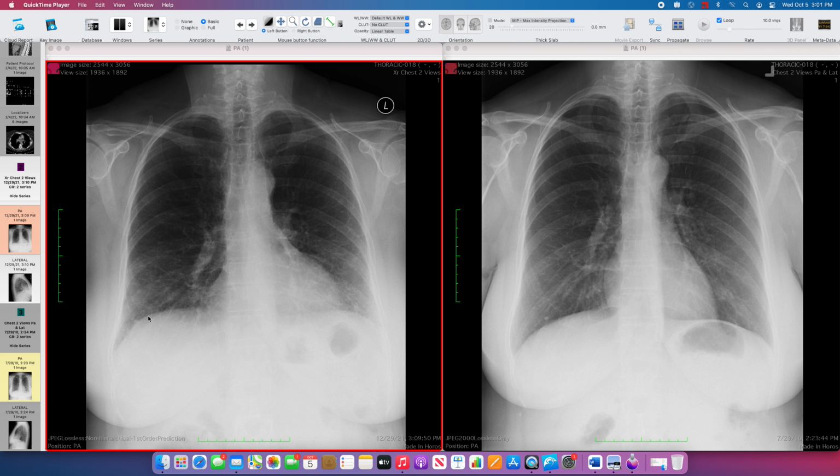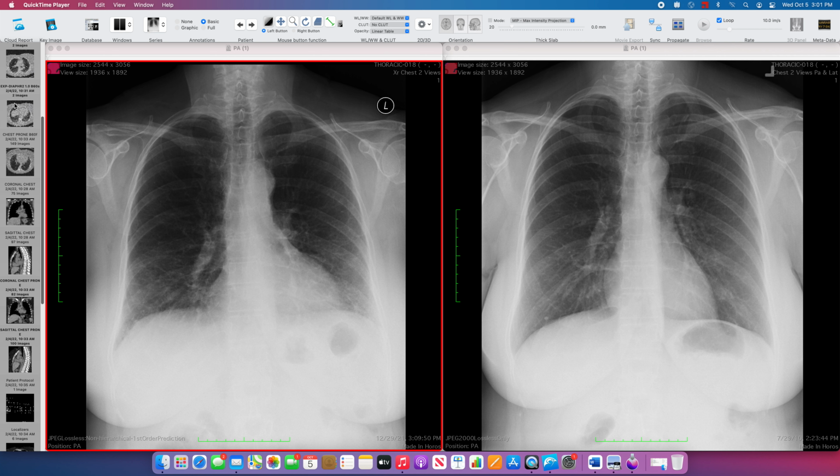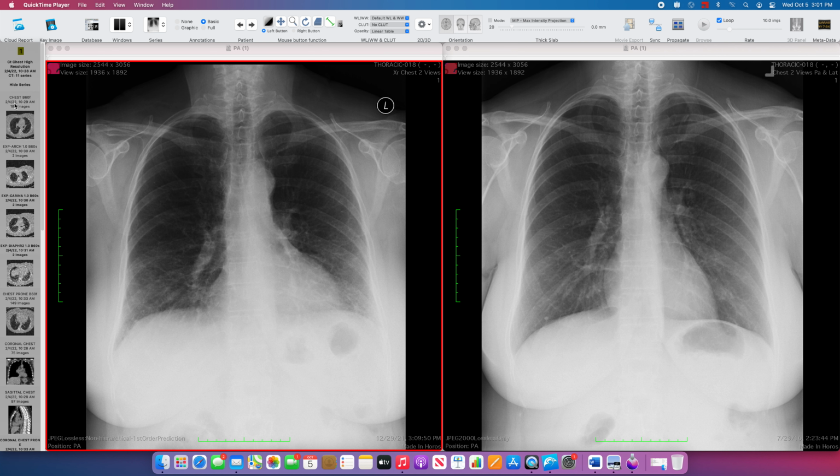When I use the word reticulation, I am already implying that there is fibrosis present. So the presence of reticulation is implying fibrosis. So in that setting, in a symptomatic older female, I would recommend a high-resolution chest CT for further evaluation.